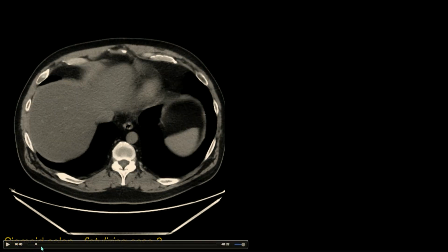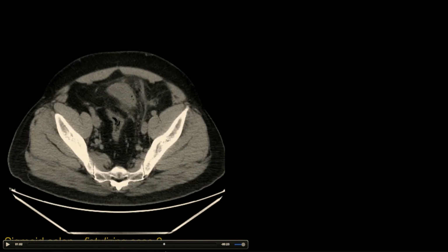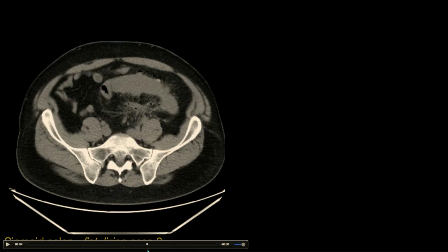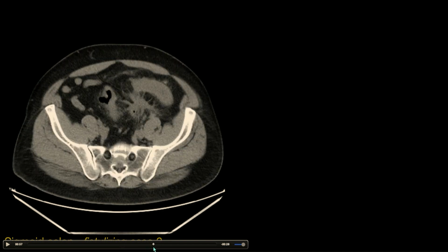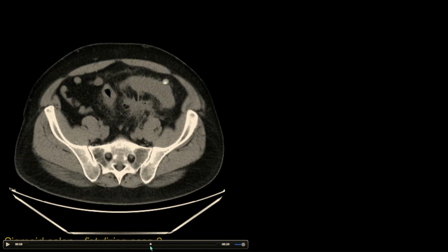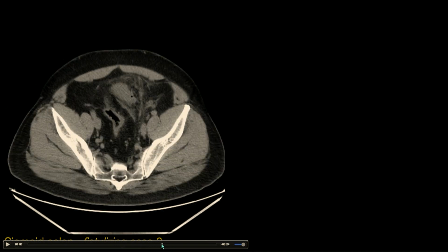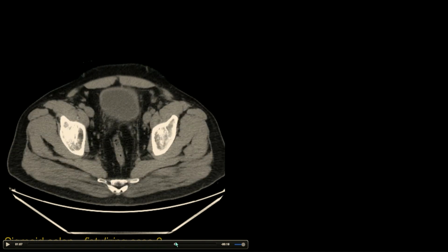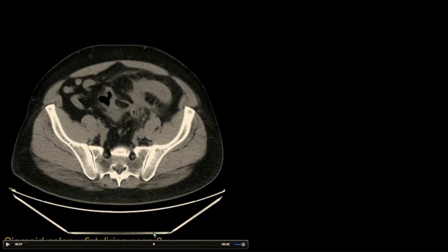This non-con CT is a little less inflammatory than the last one, perhaps, overall, but shows more within the mesocolon, this complex, arborizing, fistulous mass causing multiple points of branching and communication within the sigmoid colon. So again, chronic fistulizing diverticulitis. And then as we scroll down a little bit, we can appreciate it's burrowing into the wall of the urinary bladder, causing urinary bladder thickening, but no intraluminal air. So starting to form an early fistula there.